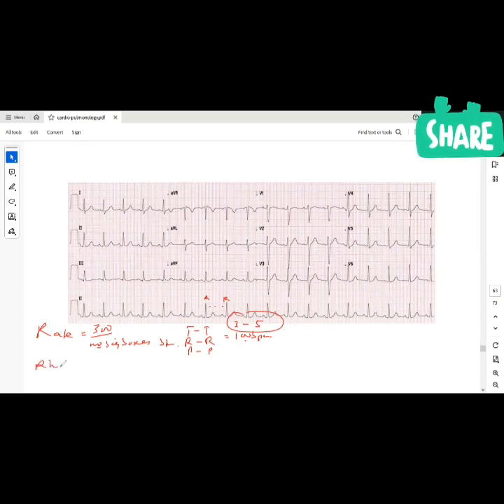Next, check rhythm. What are you looking for in rhythm? Two things. I'm looking at the regularity, and the second thing is: is the rhythm sinus or not? Those are the two things you're looking for in rhythm. Is it regular? Is it sinus?